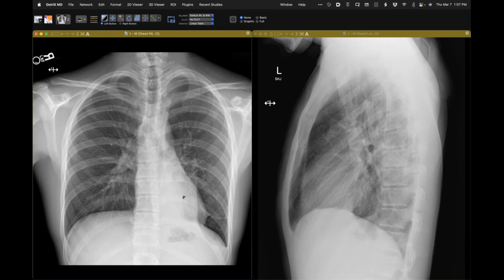And then finally, in my experience, the relevant observation that is very typically not appreciated is the left hilum. The left hilum is not normally situated. The vascular left pulmonary artery, the hilum, is depressed and also rotated medially. If you look at the vessels going towards the hilum, these here, they're clearly going to a point which is more inferior and rotated medially than usual. So those are the main findings here of obstructive left lower lobe atelectasis, left lower lobe collapse.